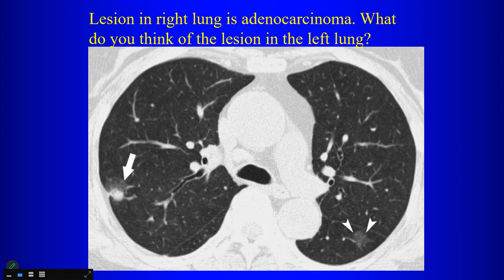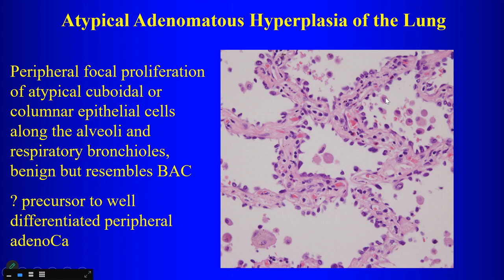So it could be a metastatic lesion, could be an inflammatory lesion, but there is another lesion that is very typically found in patients with cancer that can present as small ground glass attenuation nodules. What are those lesions? Atypical adenomatous hyperplasia, right. Those don't tend to grow. Those don't form into lung cancer, but they are a marker that the patient is at increased risk for lung cancer. So often in patients with lung cancer, there may be other foci of small ground glass attenuation nodules that are not necessarily metastases. These can represent areas of atypical adenomatous hyperplasia.